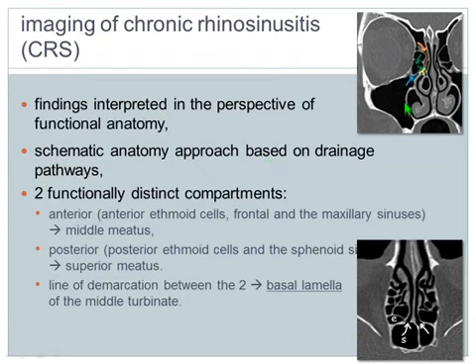The anterior pathway, you know very well, is the yellow point, and the yellow point is the final area for the drainage of the frontal sinus, orange, the drainage from the maxillary sinus, blue, and the drainage from the complex of the bulla and the anterior ethmoidal cells, which is green. The second path is the path for the superior meatus, and this can be better analyzed in the axial plane.